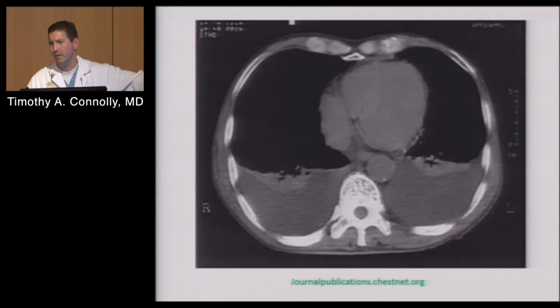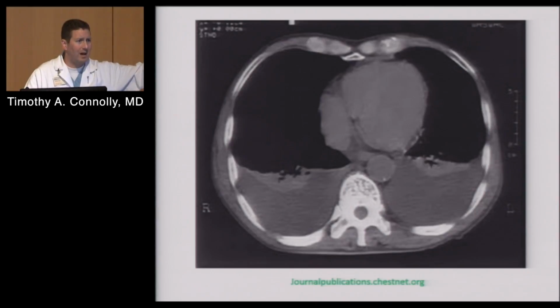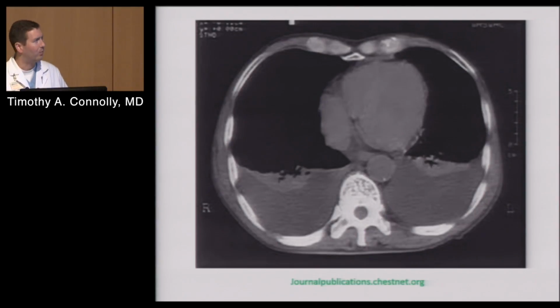This is heart failure. They just need diuresis. If it were unilateral, then we're not quite sure what caused it. But when you see this, which we see all the time, and they're not in distress, relax, give them some Lasix. If it doesn't go away, then we can tap it.